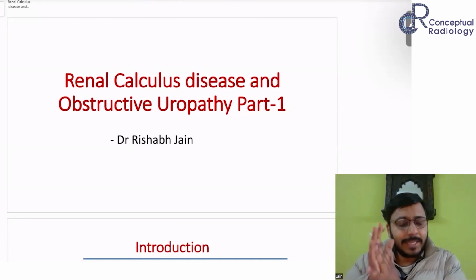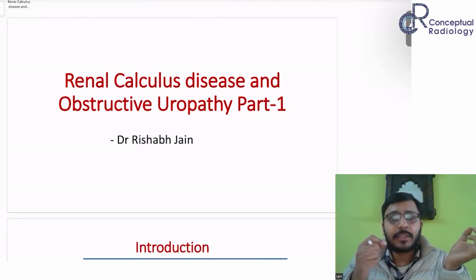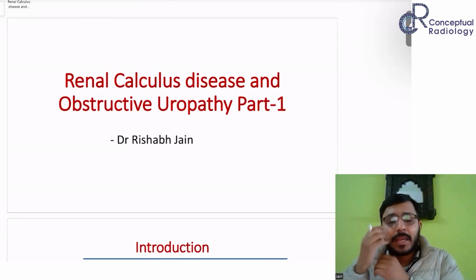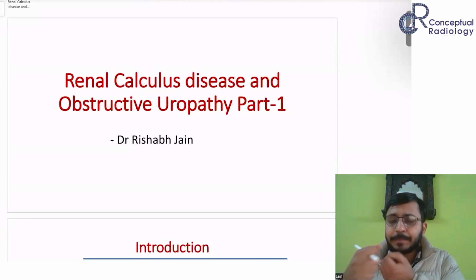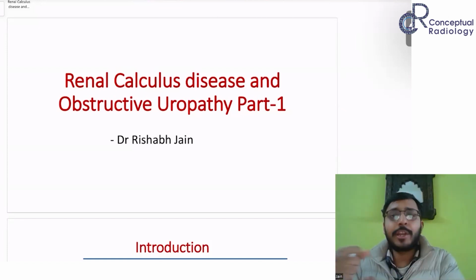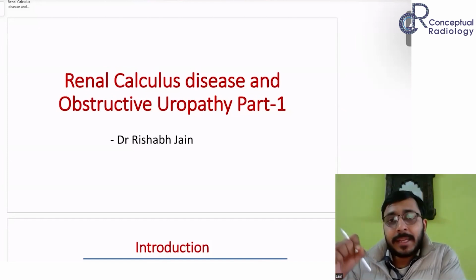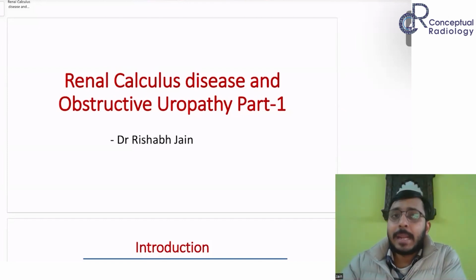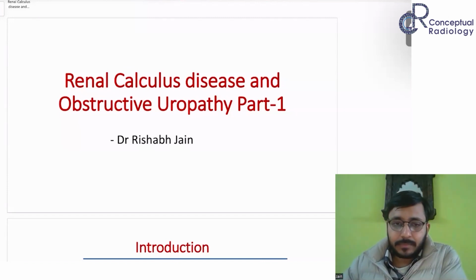So in this, we'll basically talk about the different types of stone, their imaging modalities in the form of ultrasound, IVP, and NCCT, and how the different types of stones can be differentiated on dual energy CT, and what are the latest AUA guidelines with respect to management of different renal stones, because I also want you guys to know what you are reporting, how is it beneficial for the urologist who is operating. And it's very important for us to mention some key pointers in a report which will help the urologist plan an effective treatment. Right, so let's just start.